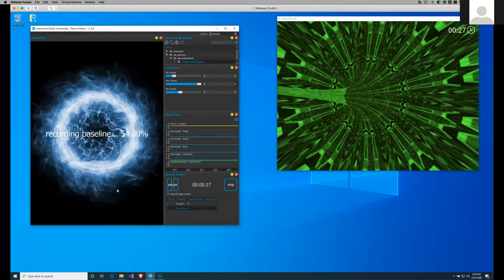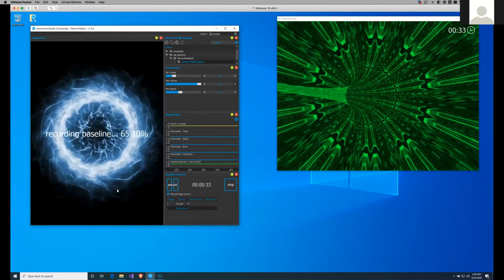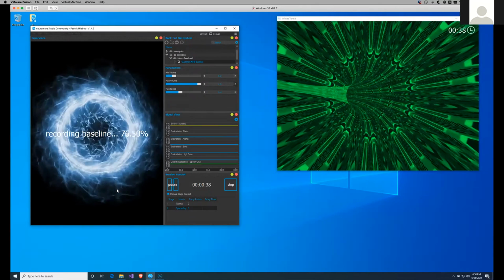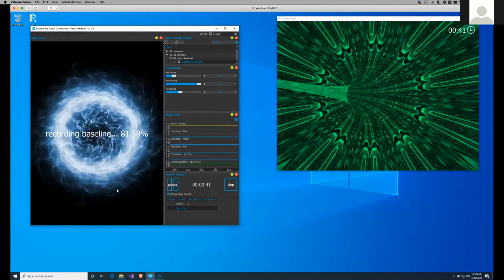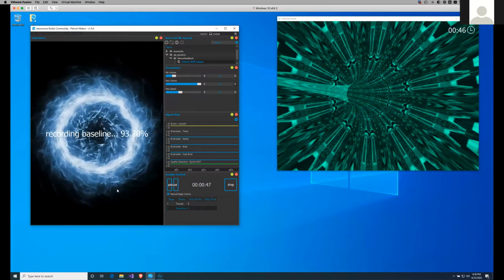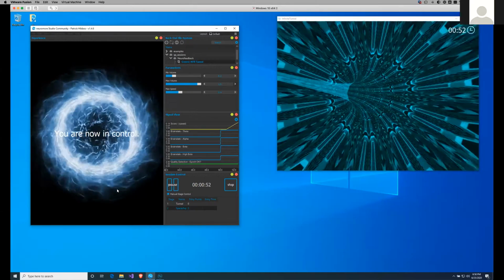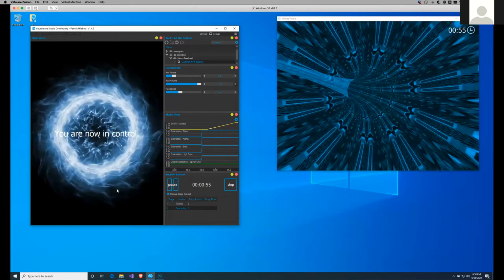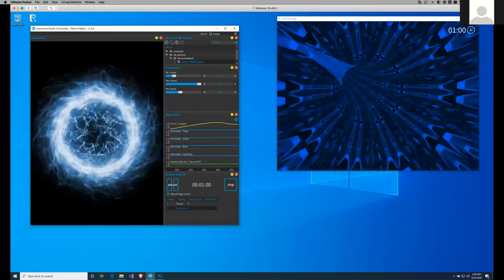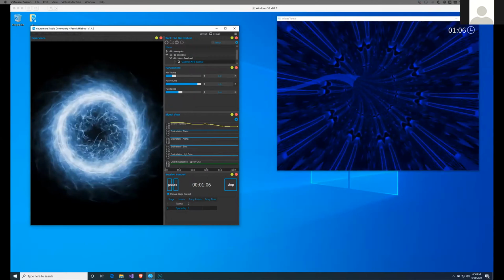Again here, most likely that's not medically valid, that you record a baseline while you expose people to an introduction or some audio. For demonstration cases, it works out perfectly. Right, we're getting close to the 1,000 valid epochs, and we have the 1,000 valid epochs. Now we're going in the tunnel. As we've seen in the state machine, every 20 to 30 seconds there's an audio cue based on the score. Let's just pull up my speaker.